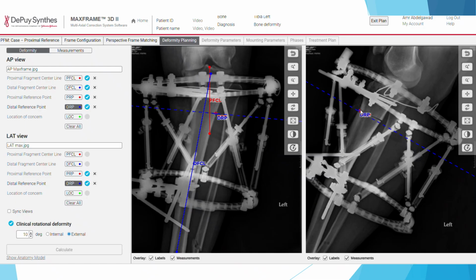Usually I put it in the lateral view. I usually go to the center here. So let's go here proximal and use this also in the center, because there is no deformity in the lateral, and we can always push this up here slightly. Okay, so both now they're both in the center here of the bone. I'm going to talk more about why I picked this, but this is just in the beginning to tell you here are the 4 points that are above and 4 points that are below.